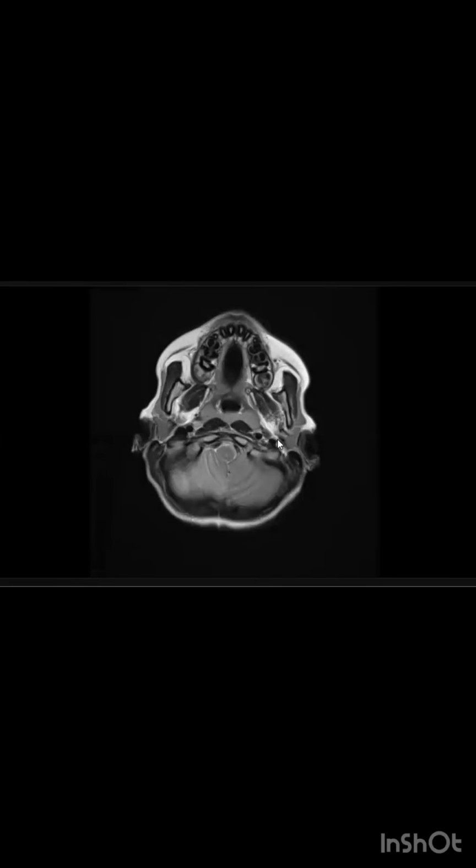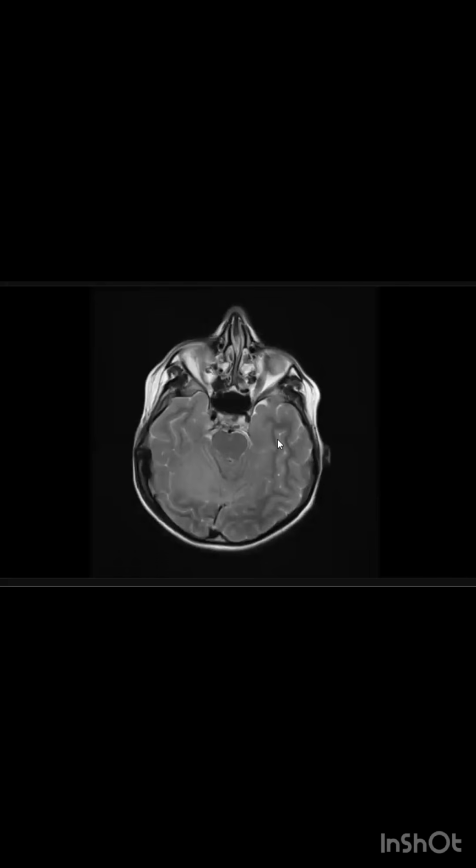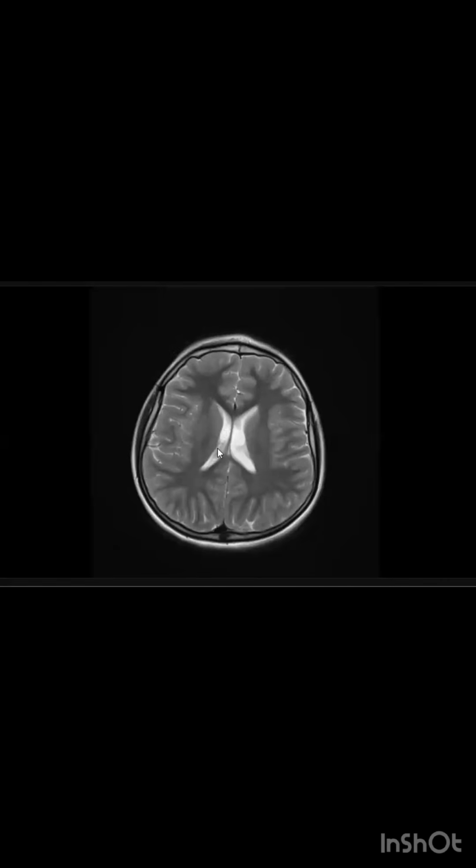You told there is hydrocephalus. Can you confirm the presence of emergent hydrocephalus in this patient? By looking at the temporal horns, if the temporal horns appear prominent, it is the first sign of hydrocephalus. There is also some effacement of the cisterns on the right side of the midbrain, so it also represents some pressure effect. It also appears to be an emergency here.